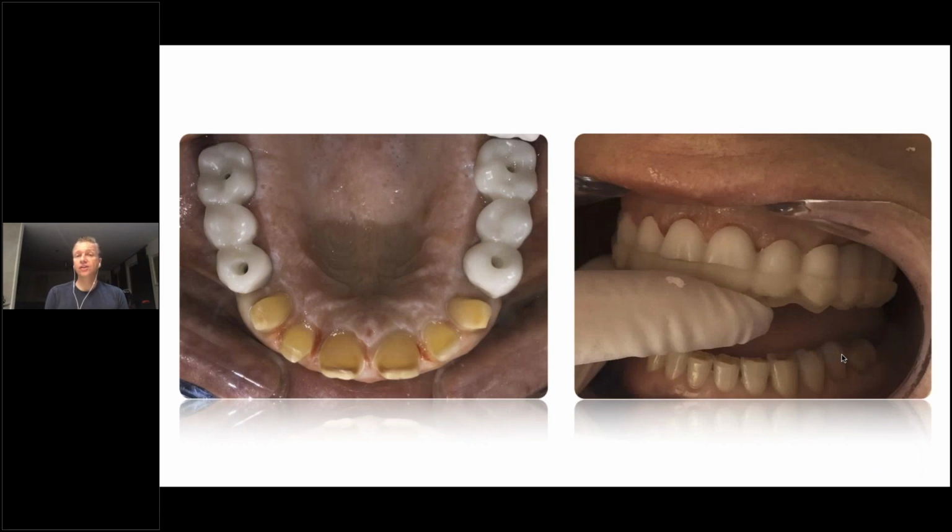Now she can put these shells into that stent, fill them with Luxatemp or a temporary material to reline them, and seat them over the 2 bridges all together in the patient's mouth. That allows her to have these anterior shells in the exact same position as we have on the computer screen as our design. So that's how you keep full control over the position of a full-arch restoration in pieces.